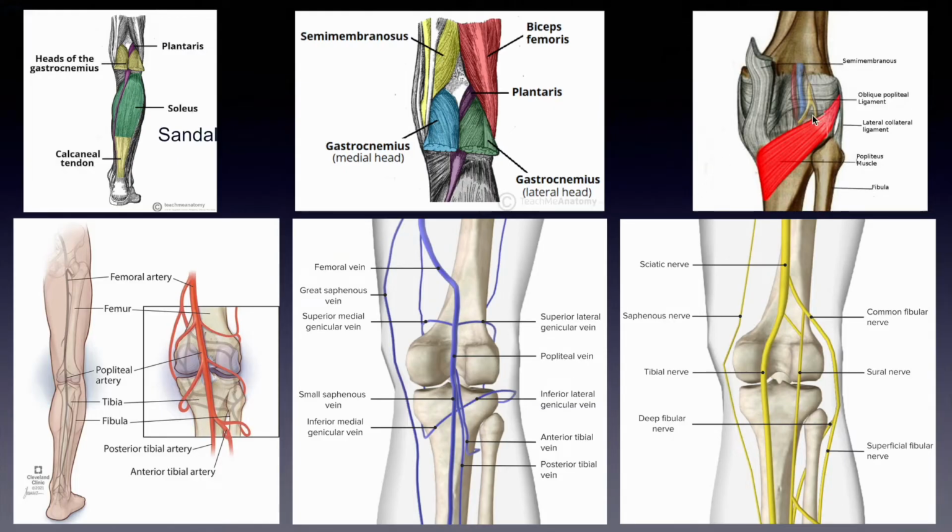Additional muscles that I want to mention are the popliteal muscle and the soleus muscle. Soleus muscle means a sandal, but in my language, Armenian, we say a fish muscle. I don't know why, but maybe it looks like a fish. This is the tail and this is the head, and you can remember it like that. This is the soleus muscle. We're going to see this too, and the popliteal muscle is here too at the back of the leg.